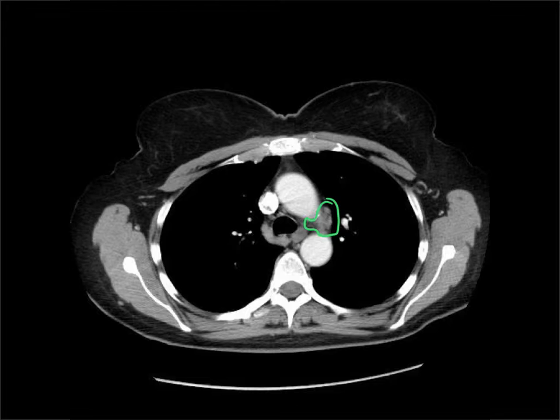So again, anything that can produce enlargement of lymph nodes in the chest, lymphoma, metastatic cancer, lung cancer, sarcoidosis can produce an enlargement of that AP window, and those lymph nodes are going to start to bulge out like this. Another tumor to look for in this area is small cell cancer of the lung. This has a predilection for the mediastinum, and often you can have this big tumor which just starts to poke out the AP window before you notice it.